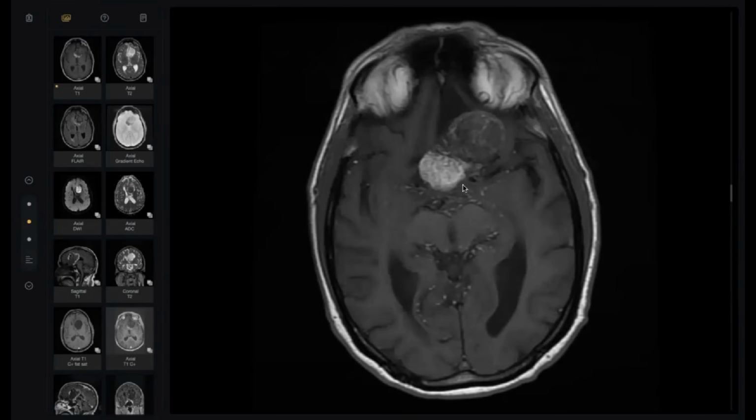Intraparenchymal fat. You find intracranial fat globules like this, and you can't find any intracranial fat-containing lesion. What's your next step? I don't know.